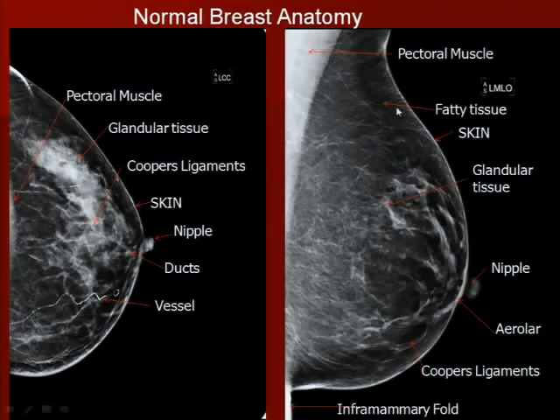Now just to run through again, you have the breast that's convex, you have a nice surface, that's your skin. Now that's your nipple there, and this is the areola around the nipple. You have these thin lines, these thin dense lines. Fibrous tissue is always dense. These are Cooper's ligaments. So you have these Cooper's ligaments there. The glandular tissue, they are also dense.